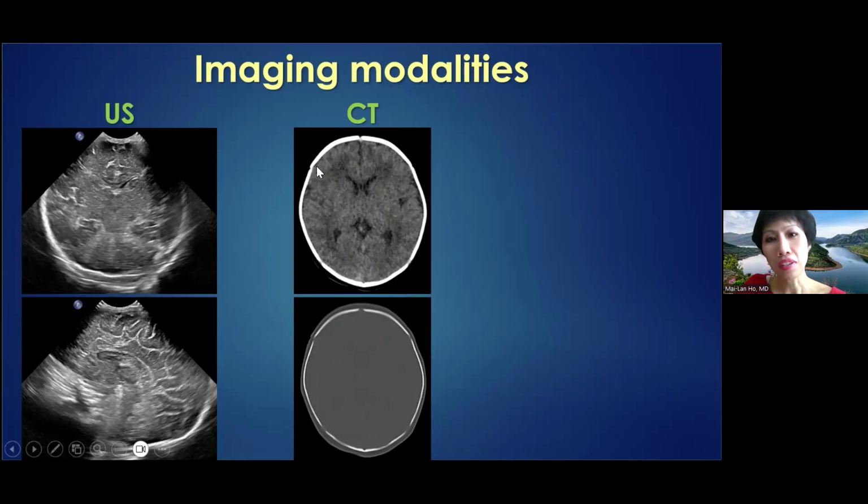And so here, you can see that the neonates have waterier brains than adults, right? Because they're not myelinated yet. And so it is a little bit more hypodense here, and that's normal. And the overall volumes are fuller too, right? So unlike the atrophy you see in the adult brain, you actually have relatively smaller ventricles and subarachnoid spaces for much of infancy and childhood. Now you can have the so-called benign enlargement of subarachnoid spaces transiently, around 9 months or so, and self-resolving around 2 or 3 years, but not in the neonate.